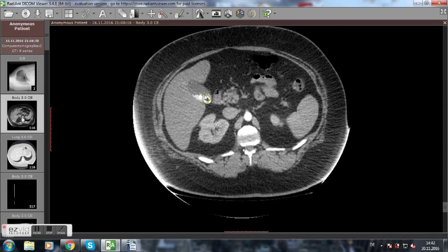They typically contain 20 to 80% cholesterol. You can see here in the center that it's very dark, like the fatty tissue, like the cholesterol. And on the outside, the common constituents are calcium carbonate, like in the bones. That's why they are so bright on the outside.